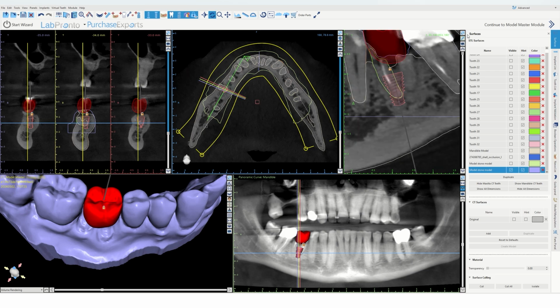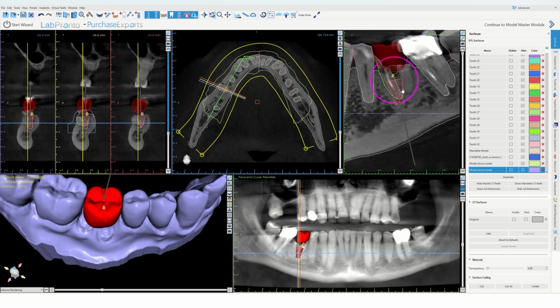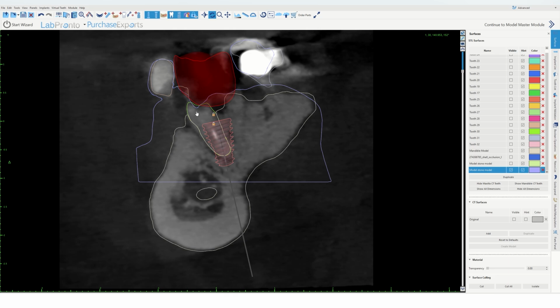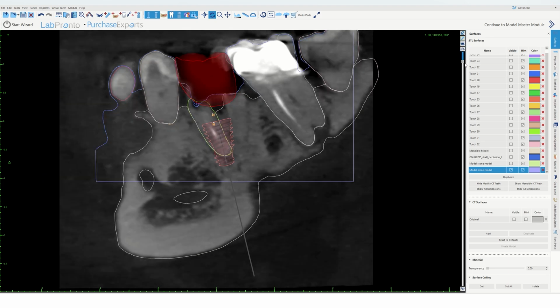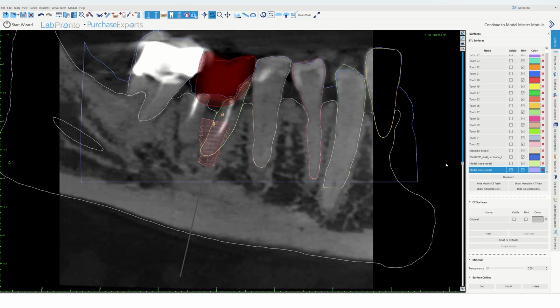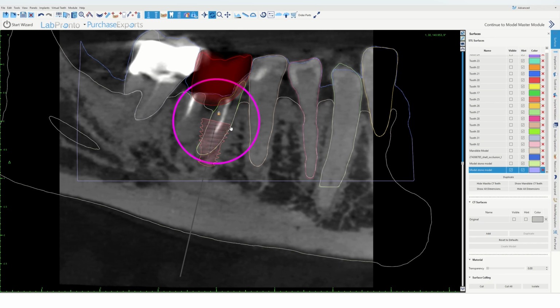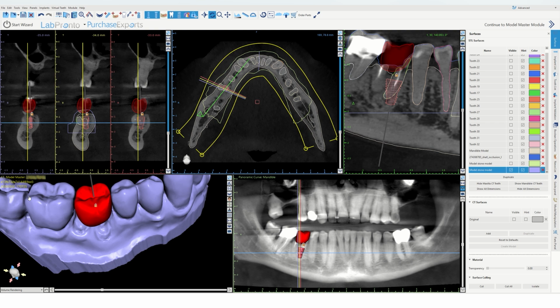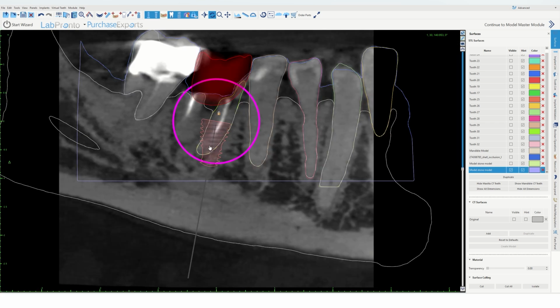All right, start at the top. Remember, there's no bone here when this extracted chunk of tooth is missing. I'm not crazy about that. Or I'm not too happy about that, is what I mean. All right, I would have bone here on the mesial if I put the implant in this position. Let's see how that looks. Yeah, that looks good over here. I'm pretty happy with that. Now let's lock the implant so I don't accidentally move it.